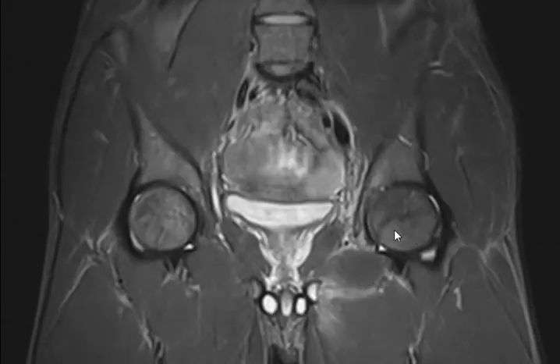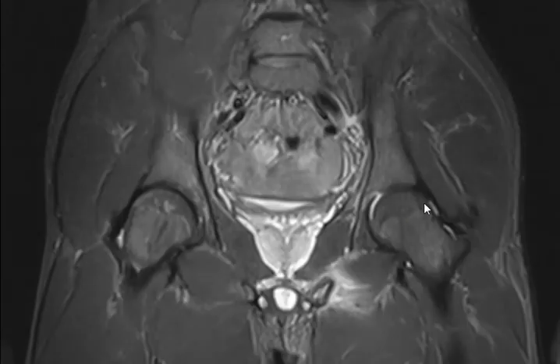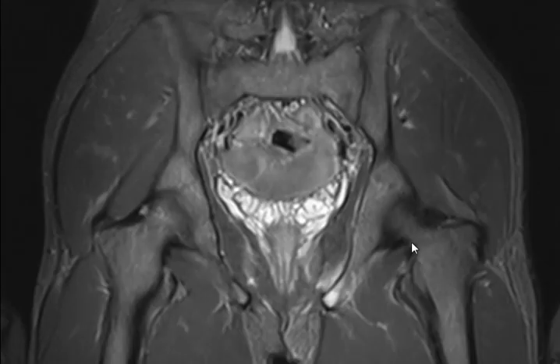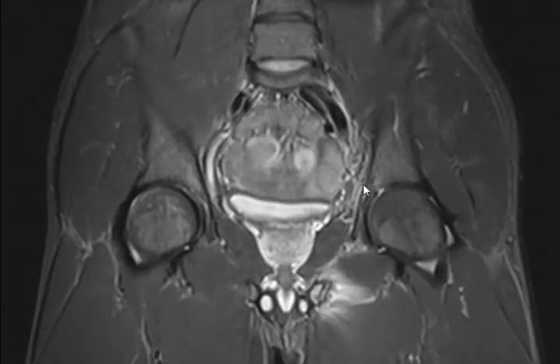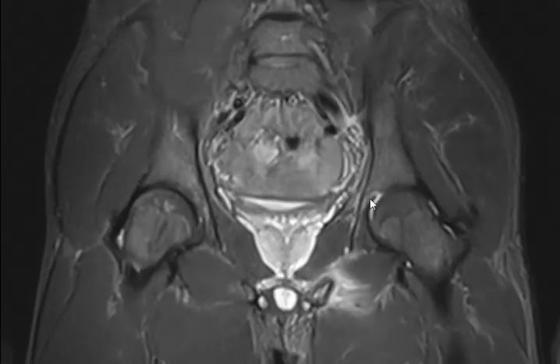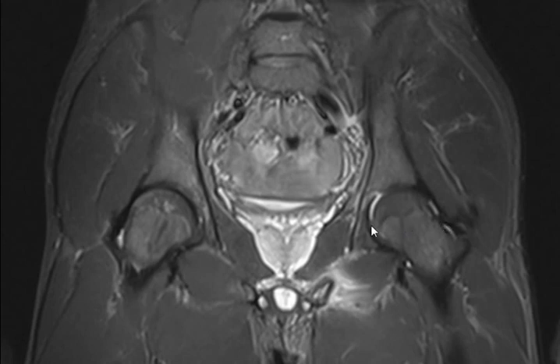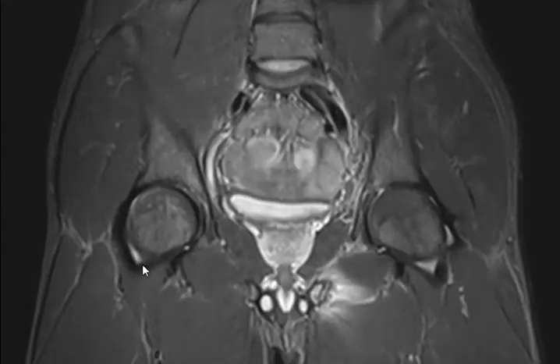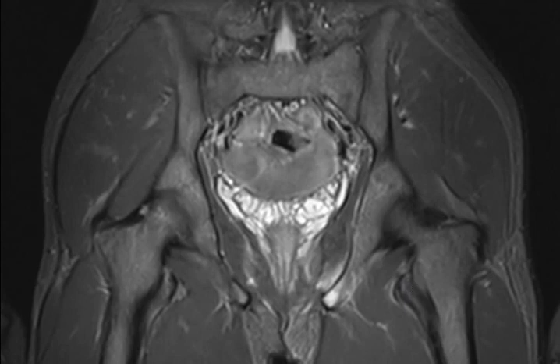Both the hip joints show normal joint space, and I think there is normal contour of both femoral heads. Beautiful, excellent. Okay. I see some high signal here. Maybe this is fluid inside the joint. This is the normal fluid. Yes, if you see, it's normal, I think. Also present, yes. Totally agree. Yes, it's almost normal. I agree with you. So why is he in pain?